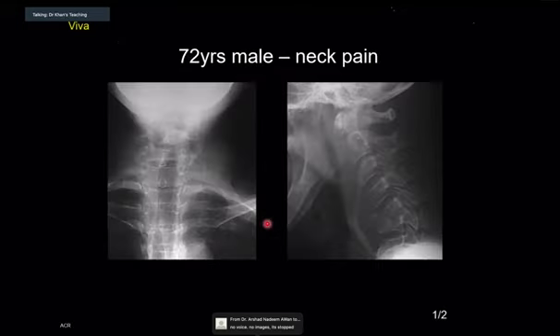This is too simple a case. Just give me your diagnosis without description. So the C5 vertebral body on the lateral. The C6 vertebral body has lost its superior margin, and there's quite a marked amount of dislocation, because I cannot align, and there's facet joint dislocation as well.